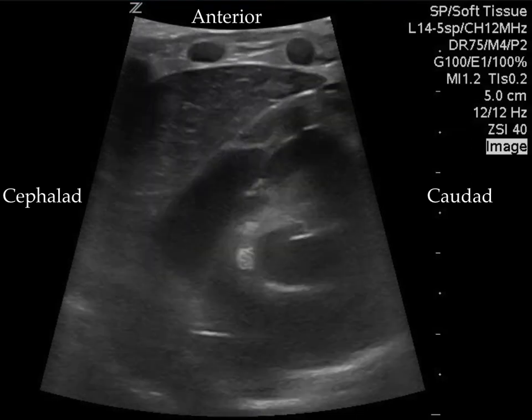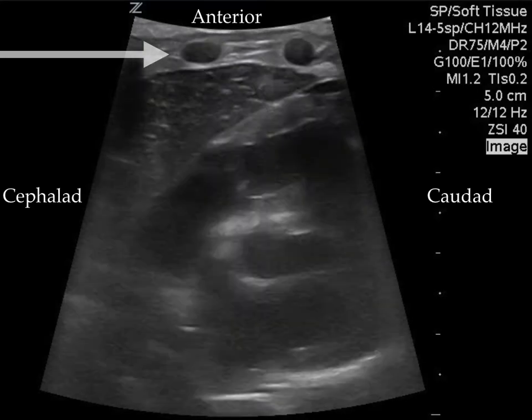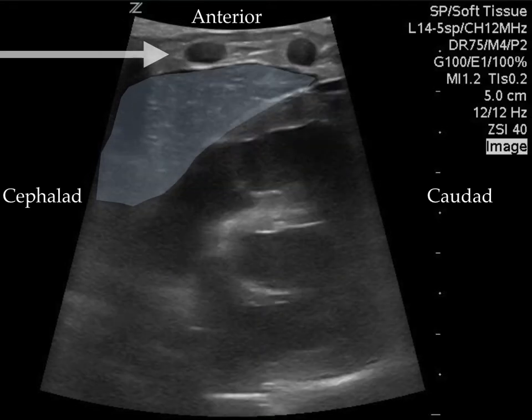This is an example, and it was one of the other things on the differential, of what the thymus looks like. Here we have a rib, still cartilaginous, and right here is the thymus. Now, with all that done, let's just go through a couple cases.